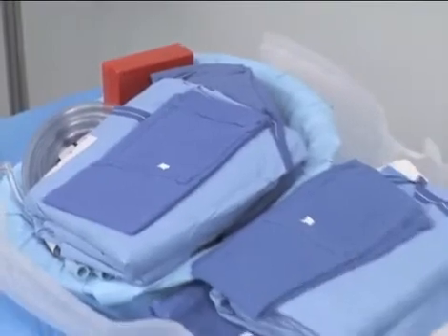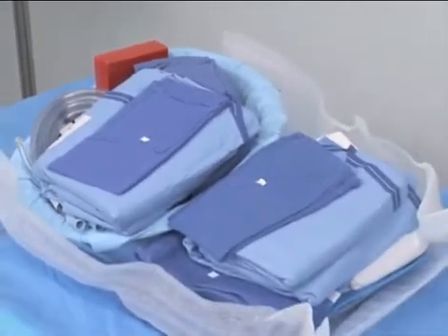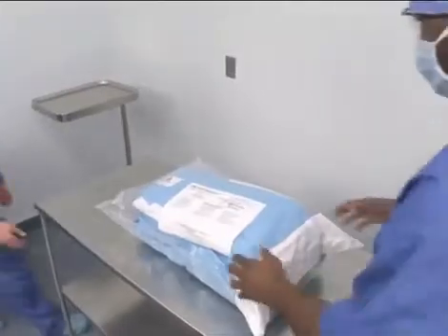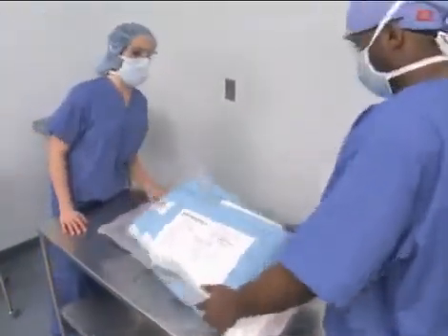Pre-assembled case packs can be custom designed by the institution to include surgical supplies routinely used during specific types of surgery. Some commonly pre-assembled packs include abdominal, orthopedic, and minor surgery packs. Before opening any sterile pack, be sure to check the integrity of the outside of the package for strike-through and the external indicators for verification of exposure to the sterilization process.